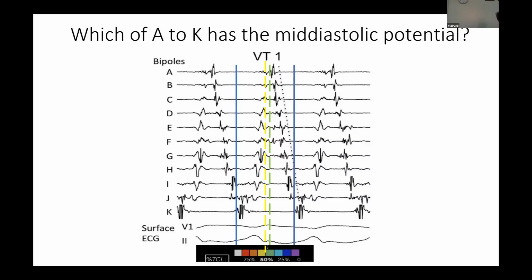If you did not drive the cycle, you don't need to do anything, just redo it. The second one is to confirm whether the morphology is the same. If it's different, you will consider that you have a manifest and probably you are pacing the outer loop. The third part is you try to measure the PPI and also look at the electrogram.